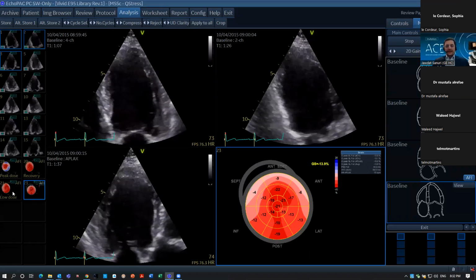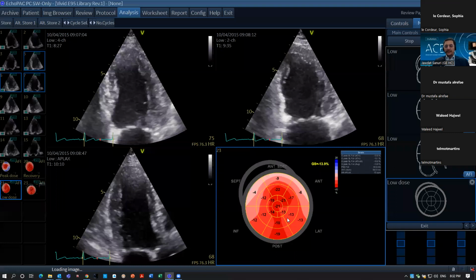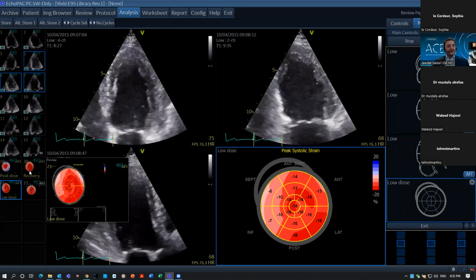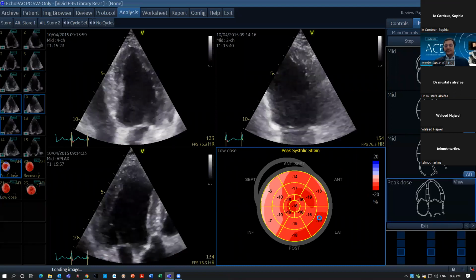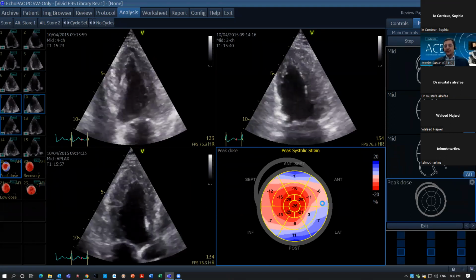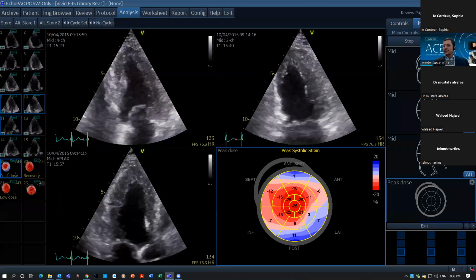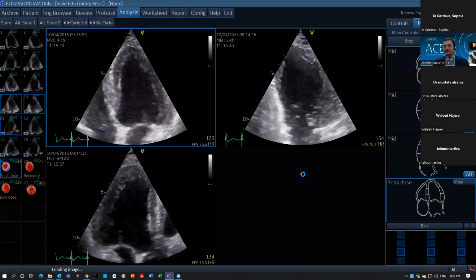Right coronary as well. If you look at the low dose bullseye, this is the bullseye done for the low dose. Again, it looks improved in the left coronary, with a little bit of reduction on the right side. But if you go to the peak for this patient, look at the circumflex now. It's giving us different information here, the circumflex as well as the LAD territories. You can see a huge reduction in the strain. The GLS, the global strain value, is not showing here for some reason, but we can go to the AFI again and you can see the actual values for this peak.